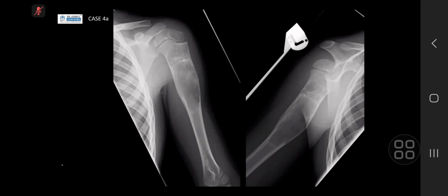Again, I'm really sorry, you cut out. What was your top diagnosis? Fibrous dysplasia. Okay. And what other things occur in children in this location? Aneurysmal bone cyst, ABC. Okay, and so we've just seen an aneurysmal bone cyst, and they tend to be eccentric, so this is fairly central. Yeah. And predominantly within the diaphysis, extending into the metaphysis, proximally, I guess, but it's predominantly within the diaphysis.